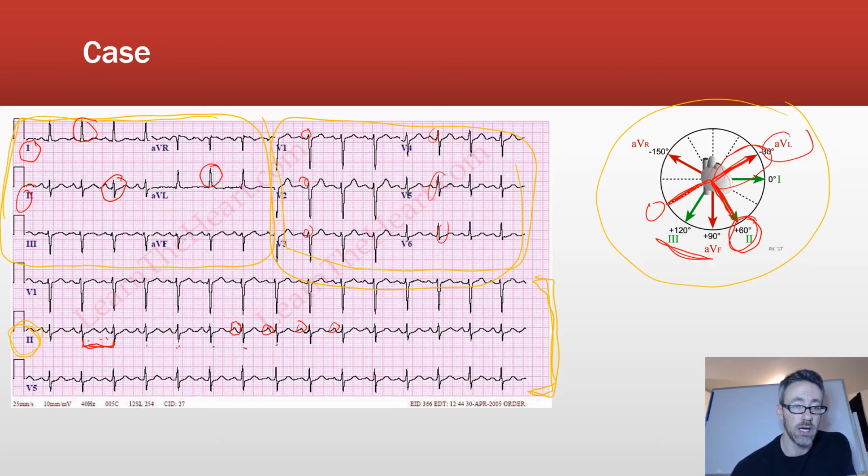So the QT, using that method that I talked about, if you want to assess the QT interval, let me see if I can find a good wave here. All right, so if we have the start of the QRS to the end of the T, and then the R to R interval. It should be about half or a little bit less than half, about 40% of that R to R, and that looks to be approximate. So yeah, the QT interval looks okay. And then like I said, from that first approach, after that you can kind of look for any kind of hypertrophy. Do the R waves in any of the chest leads look like they're very, very tall?